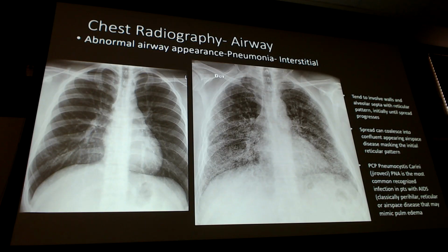If you get an x-ray like this and they're not HIV/AIDS, right? They're not on chemotherapy because they're fighting cancer off, or any of your main things that would make immunocompromised, you have your spleen. Good to ask that. But anyways, this would be the only one here. Again, grainy, looks like you took a pile of sand and threw it on the x-ray. That's your interstitial pneumonia concern for immunocompromised patients.